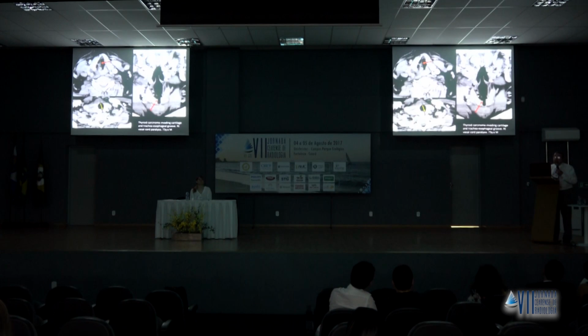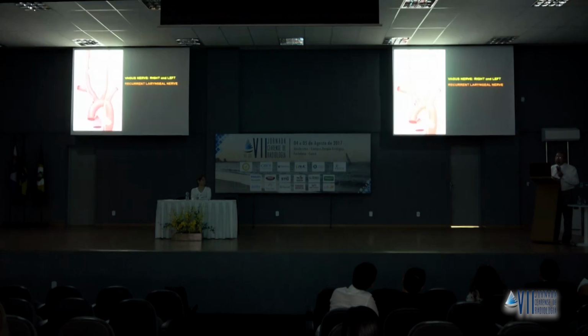Okay? Now, this patient had a vocal cord paralysis. You see here the vocalis ligament and atrophy of the vocalis muscle. On the coronal, you see the paralyzed atrophic right vocal cord with a very prominent laryngeal ventricle. On the other side is a normal true vocal cord, and here's the false vocal cord. And this here is the recurrent laryngeal nerve. What's causing the vocal cord paralysis is a very aggressive tumor, a papillary cell carcinoma, extending to the tracheoesophageal groove, leading to atrophy of the right vocal cord.